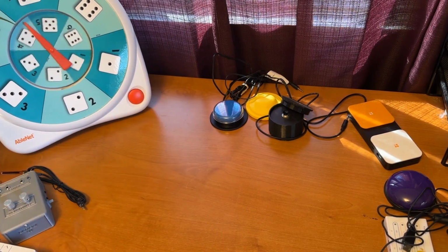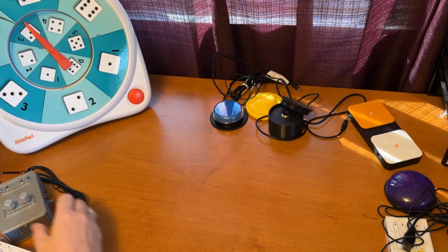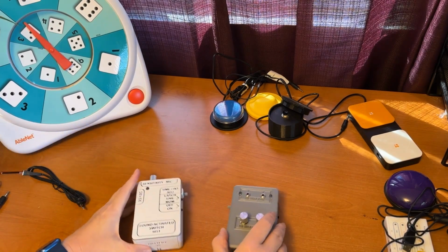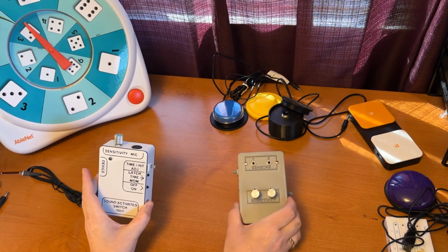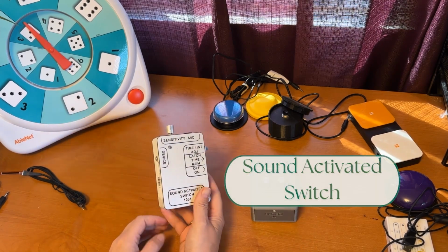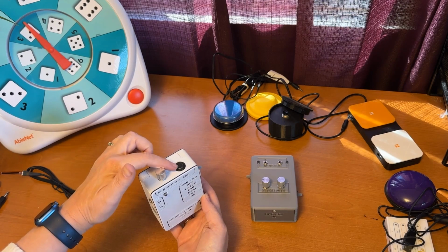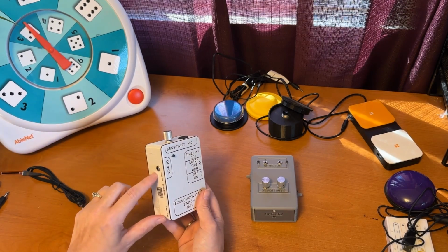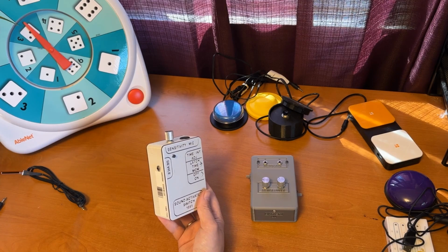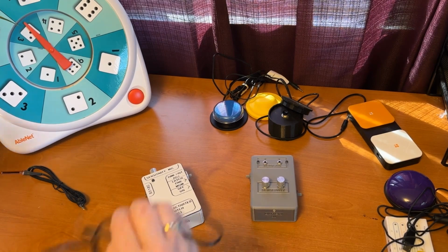Okay, so other types of switches. In addition to simple button switches like this, there are other switches that can be used in alternative ways. Here are a couple of examples. This one is actually a sound-activated switch. You can adjust the sensitivity here for the microphone. You plug the device in here using one of these cords that go from device to device.